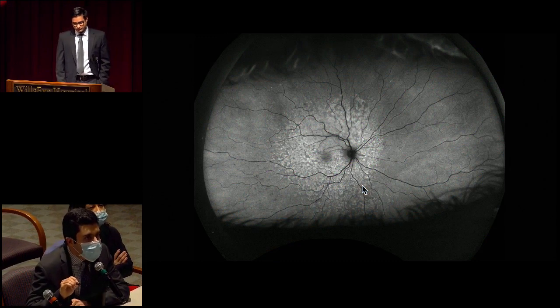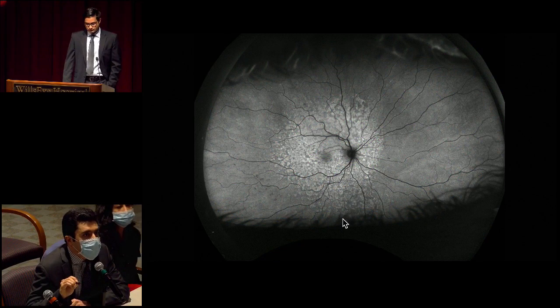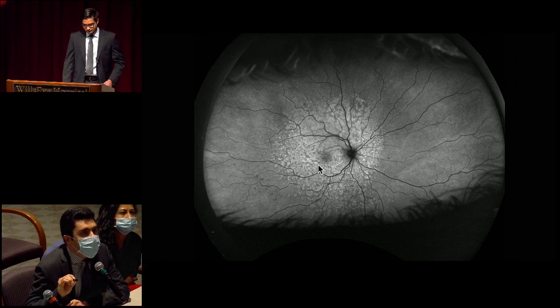So we have a wide field fundus autofluorescence of the right eye. Our attention is drawn to this background hyper-autofluorescence corresponding to those hyperpigmented pigmentary changes we were seeing in the posterior pole. And within it, we have this granular speckled appearance of intervening areas of hypo and hyper autofluorescence. The retinal mid-periphery and far periphery appears relatively intact, and there's this one focus of hypoautofluorescence corresponding to that dot hemorrhage that we were seeing.